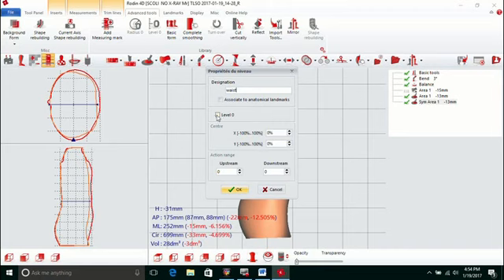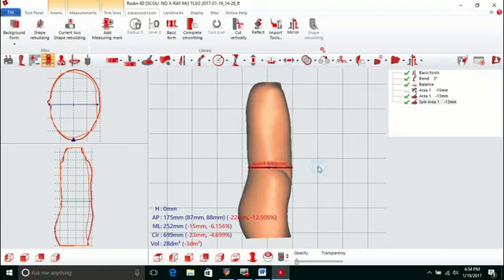Waist, we'll make that level 0. That's where all our measurements are going to come from. So when you measure up to xiphoid or pubis, that'll be the 0 point. Select OK. Now once you select OK, if you look at where I'm holding the cursor, it says waist, and then the H, the height, that's active now. So as I left click and go up the model, you can see it's reading live time. So when I apply my other measure marks, I can put them accurately wherever I want them.